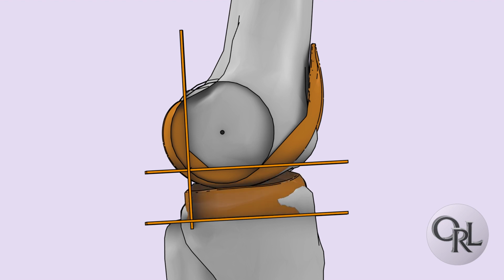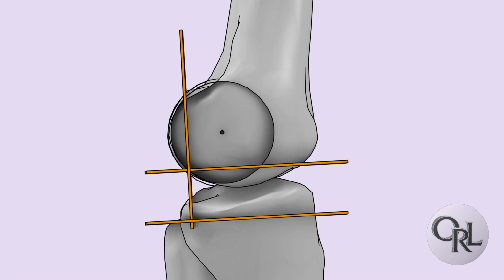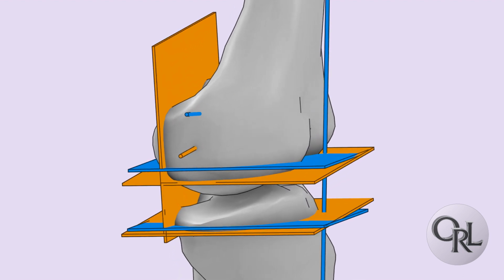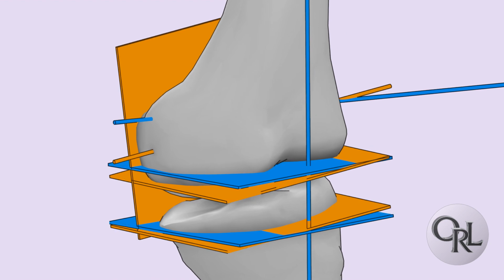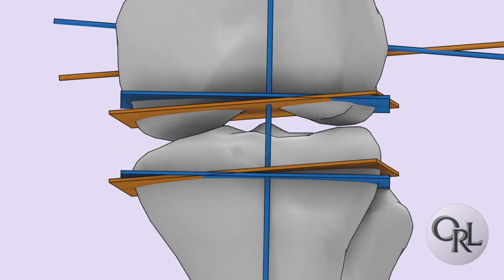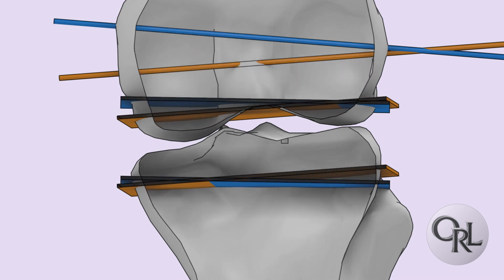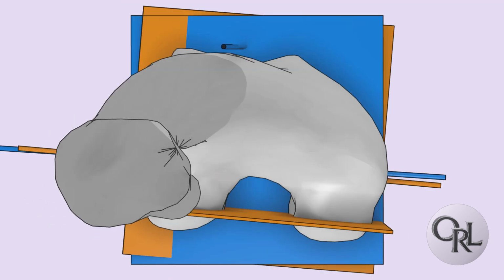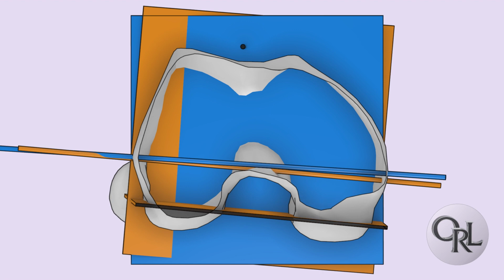The axial rotation of the tibial component aims to closely match the axial rotation of the femoral component. The kinematic alignment flexion extension reference axis and bone resection planes in orange may be compared to those of the classic mechanical alignment surgical procedure in blue. AP views and axial views are provided for clarity. On average, the kinematically aligned femoral component is 6 degrees more flexed, 3 degrees more valgus, and 4 degrees more internally rotated than the mechanically aligned femoral component.